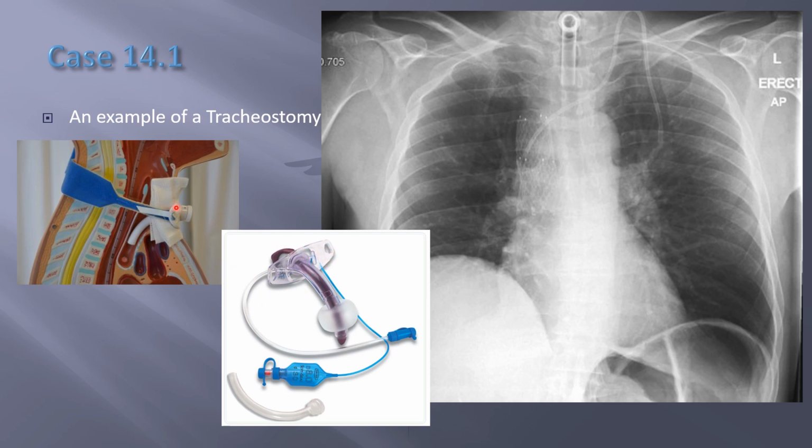Here's the flange. That's this flange here. Right now it has a purple obturator in. That's what it's called. This is what you place inside the trach before you insert it into the stoma. And of course the cuff will be deflated. This is showing the cuff inflated. So once it's in, you would inflate that cuff. This one's cuffless. It comes cuffless or cuffed.